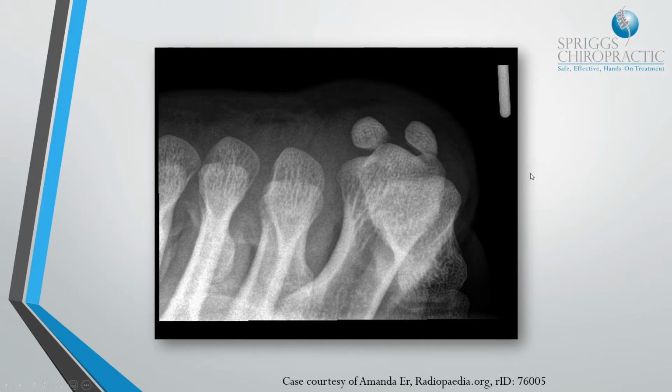This is a sesamoid view. It is very reminiscent of the carpal tunnel projection that you can get in the wrist as well. Sesamoid bones of the big toe can be fractured and can be involved in that kind of thing. To get this view, you're asking the patient to bend the toes up as far as they can, and you shoot through what can effectively be described as the tarsal tunnel, and here you'll see the sesamoid bones in profile a lot better.